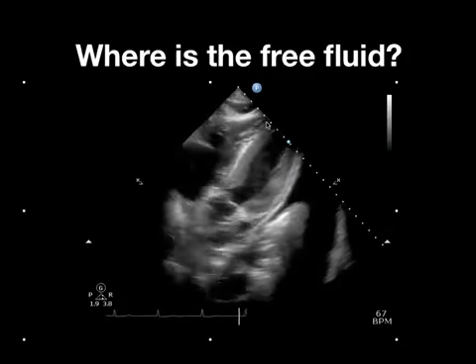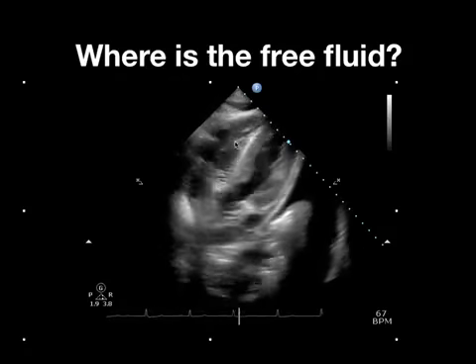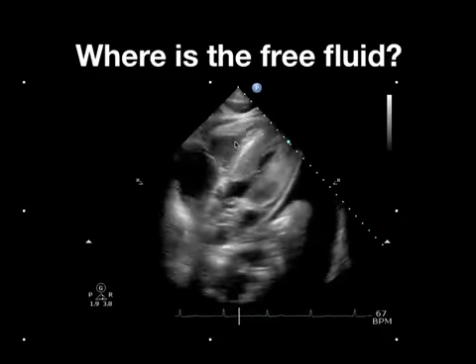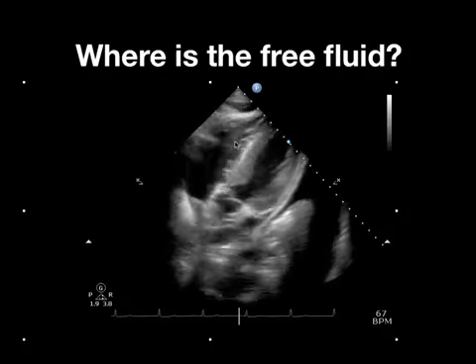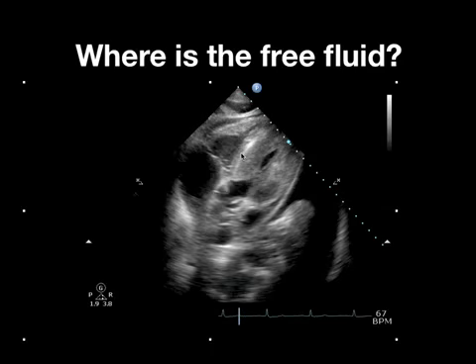Let's go through this one and see where all the fluid is around the heart. So you see that there are some areas surrounding the heart that are either echogenic or anechoic. So let's take a look at areas in detail. If we look at the heart here, you've got right side of the heart here, you've got right ventricle, right atrium, left ventricle, left atrium here. You can see that between the parietal and visceral layers of the pericardium, there's a small amount of fluid seen here. You can see that it kind of tracks along over to the right side of the heart. Apical fat pads do not extend over towards the left side.